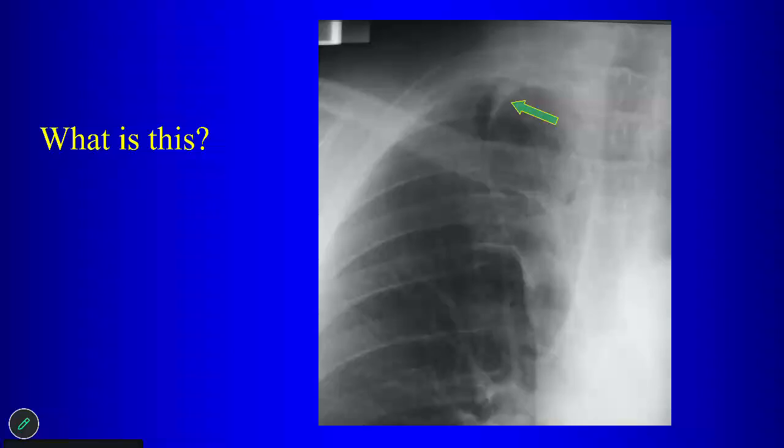The azygos starts lateral embryologically and then pulls pleura down. Yes, embryologically, the arch of the azygos vein starts more superiorly. As the lung grows around it, it migrates down to its position above the right upper lobe bronchus. But if it happens to be a little too far lateral, as the lung grows it starts to cut through the lung and comes all the way down here. Often the arch of the azygos vein, when you have an azygos fissure, doesn't get all the way down, so it winds up more superiorly than you usually expect.